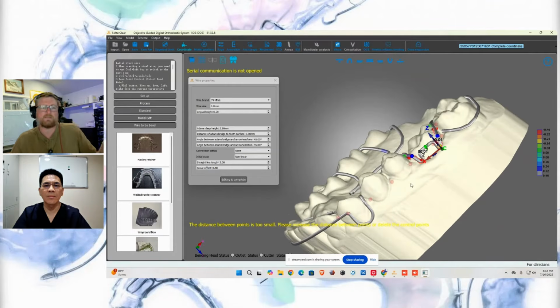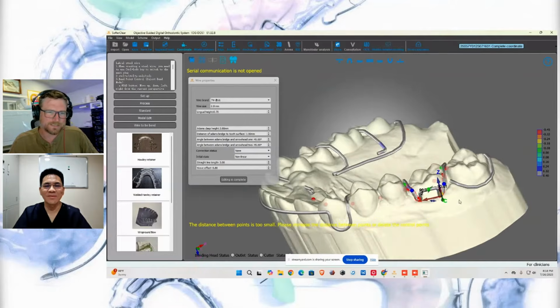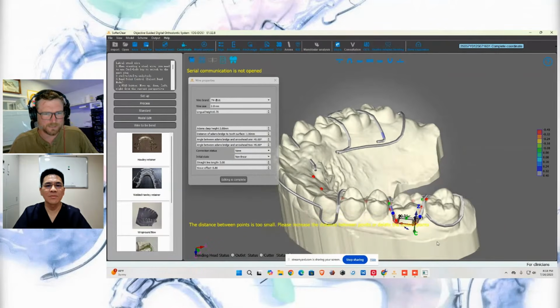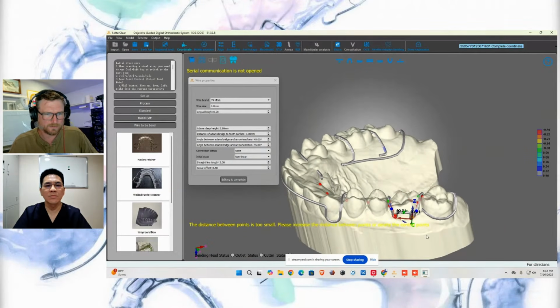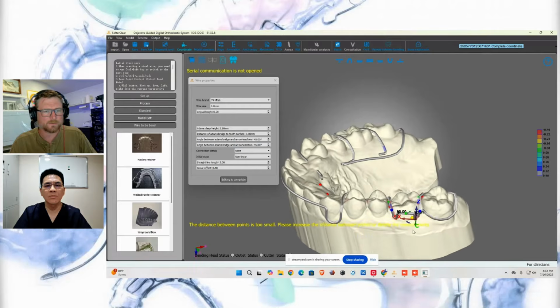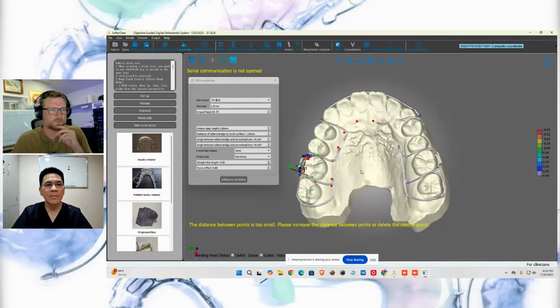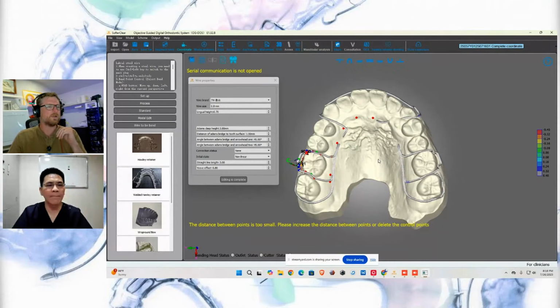So you could save a lot of time when you're doing this. This actually does need to be, I feel like, and I'm going to use the WASD keys like a gamer and move that a little bit wider. Again, I'm not going to spend too much time adjusting the wires, but you can see what you can do.